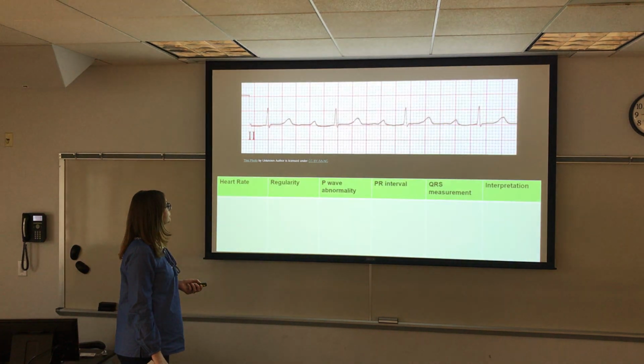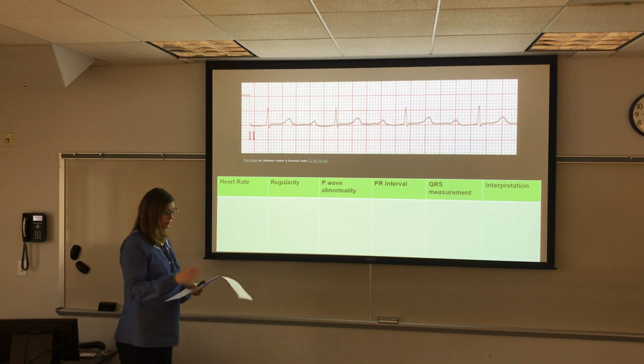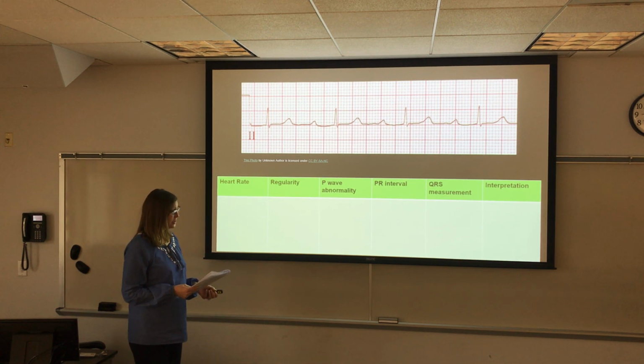Okay, our last case. We have a 65-year-old female on the telemetry unit who has a history of rheumatic heart disease. Her vital signs are stable, and she denies dizziness or syncope. And this is her strip.